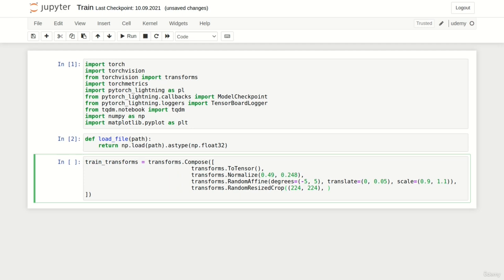The scale argument expects a tuple where the first element corresponds to the smallest crop size and the second one to the largest. A crop which contains at least 35% of the image should be large enough to not crop away any relevant parts. Additionally, we of course also want to feed images that are not cropped at all, and therefore we use 1 as the upper bound.